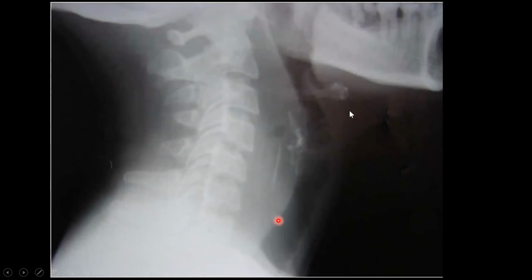Which was actually the same on our right side in the previous one, but I didn't show you. This is the trachea, okay, oropharynx and trachea. But behind that, there are some structures. This is hyoid bone, normal one.